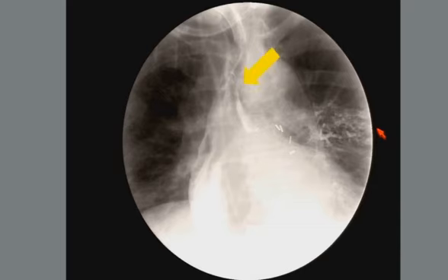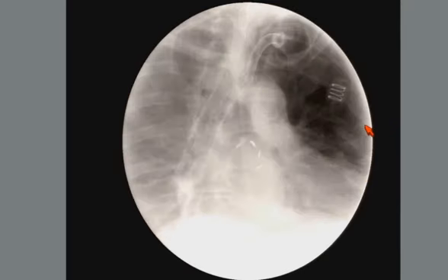And finally, some of these patients, when they leak, as here at the anastomosis, it communicates with the airway, in this case the left mainstem bronchus, and you can see the contrast entering into the peripheral airways. This raises a concern. We have transitioned all of our upper GI studies to low osmolar contrast agents. We don't use Gastrografin or Gastroview because of the risk profile. In this case, if that would have been used, that would have been a high risk of acute pneumonitis. So for any of our studies, typically proximal to the ligament of Treitz, we use low osmolar agents.